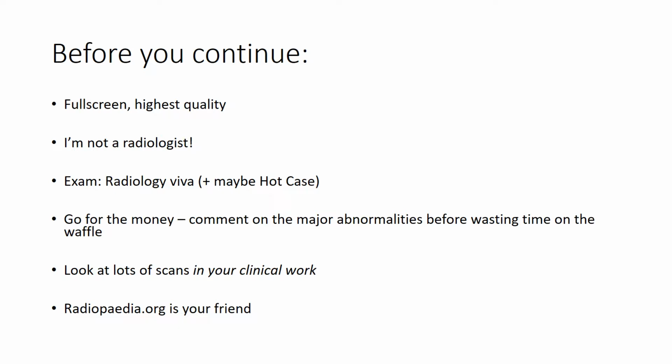So with the sermonizing done, let's have a look at some of the major pathologies you'll be expected to encounter in the exam. We'll approach this organ by organ to be as systematic as possible. We're going to look mostly at CTs with just a few other modalities thrown in.